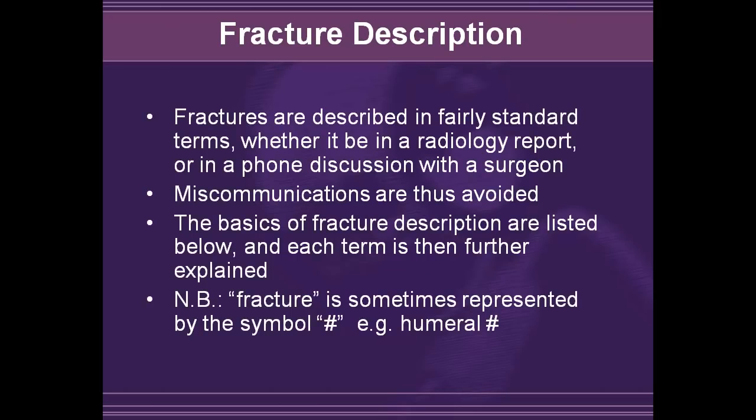Fractures are described in fairly standard terms, whether in a radiology report or in a discussion with a surgeon, and the purpose of this is to avoid miscommunications. The basics of fracture description are listed below, and each term is then further explained. We will also show examples of each of the more commonly seen fractures, and then at the end review the ones that you really don't want to miss. A fracture is sometimes represented by the symbol that you can see on the screen here, particularly on requisitions.